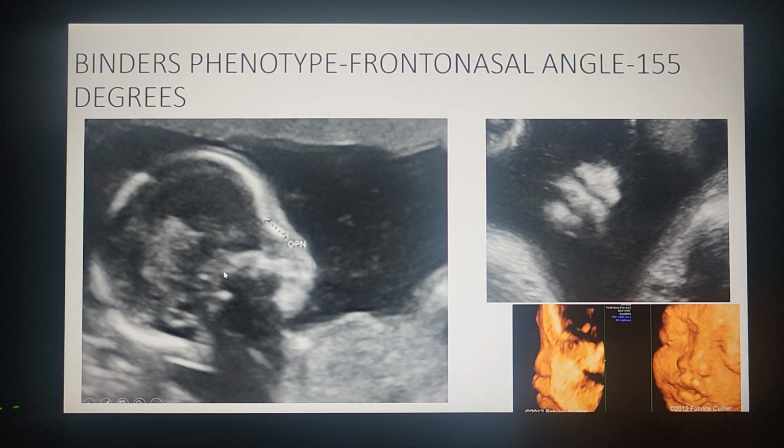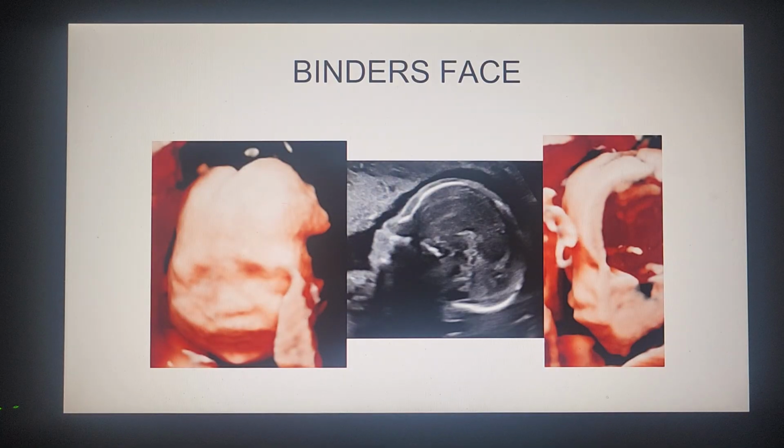It's another case showing a binder's face, and when you do a coronal view of the nostrils and lips, you will see that there is a flaring or broadening of the nose, there is a short columella, and you can see the frontal features show a flat, short and broad nose, and the lateral view shows a flat face.